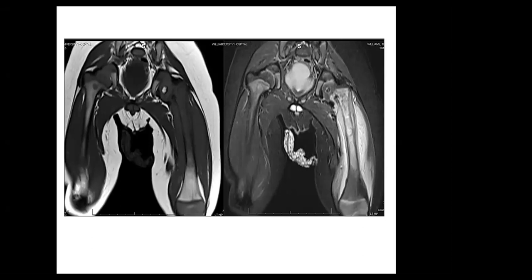You could just go for Ewing sarcoma, recommend pediatric orthopedic referral, and CT-guided biopsy or open biopsy with coordination with a sarcoma surgeon. You could also recommend doing bone scan, doing CT scan of the chest, looking for chest metastases, and bone scan for other skeletal metastases. This one here could be another bony deposit, could be metastatic lesion on T1.